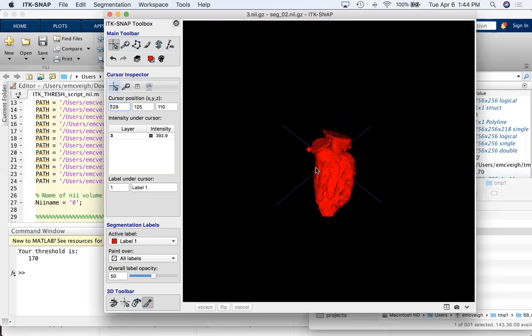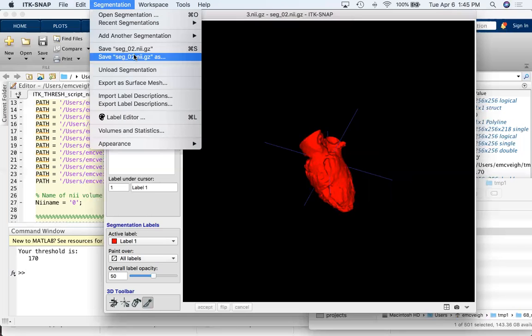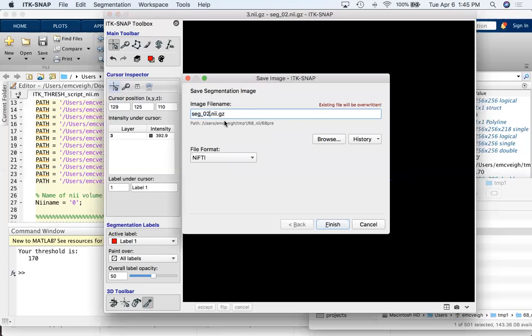Or you could do it in the planes, right? You could go in there and erase it, which is what Gabby does. But for some reason I just like using this thing. Okay, so I think that this was, we look up at the top, so we have to move it. This is 3 NII, so we're going to save this as 3, right?